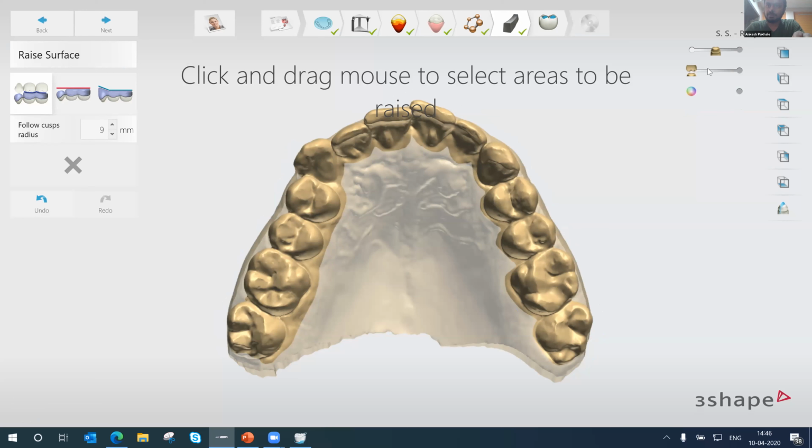First, I have set a material in configuration, but in splint mode I can only choose the 3Shape material. So Nemrut Alkan, you said first I have set a material in configuration, but I can only choose the 3Shape material in splint mode. It's not 3Shape material. It's like what machines and materials have been configured along with your system. So that is what the system has allowed.